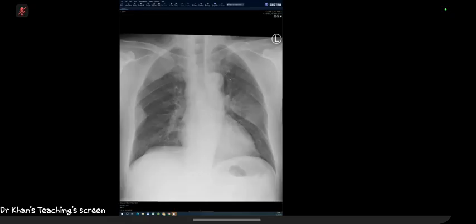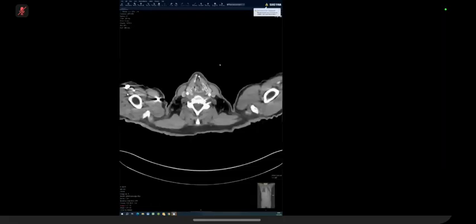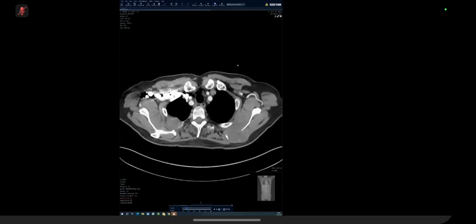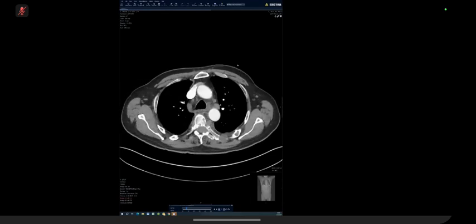However, this can also be a primary bone tumor that is invading the bones. And in that case, there would be a wide range of differentials for that, depending on the patient's age. So yes, this could be a primary bone tumor as well. I don't think it's an infectious cause, and I'm not suspecting any other non-sinister pathology in this instance. Less likely primary bone. It can also be metastatic, apologies. So they're bilateral. So if they were primary, you're saying one primary bone tumor that was metastasizing to different ribs?